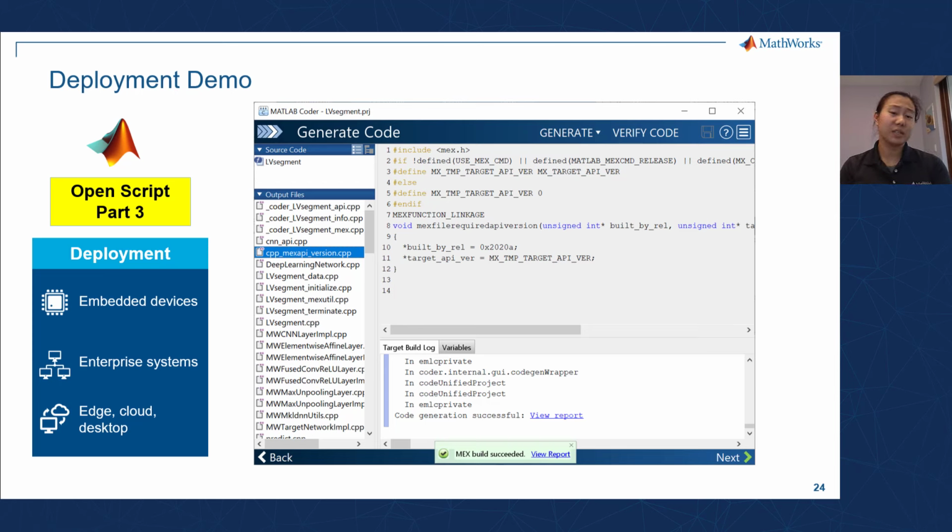So if you are curious to go take a look at the demo, you can take advantage of that last module, run it against the MATLAB Coder. You will need the MATLAB Coder for that, but you can actually automatically generate the C++ code for this particular example. And if not, I have saved the report and the final files in the demo file, so you can explore that as well.